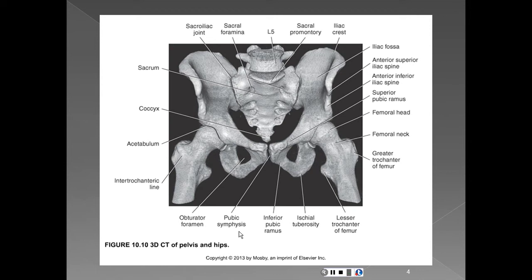So if we were to take or segment out the femur right in the middle, and this is the pelvis, but if we were to put on our x-ray vision and just try to see the continuation of the femoral head, you will see a little dip in the femoral head, and that's called the fovea capitis, and is a ligament that attaches it to the acetabulum.